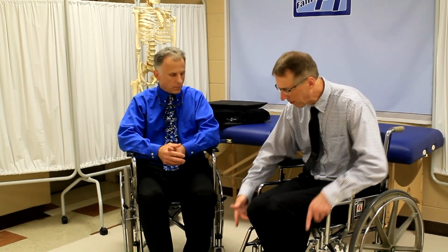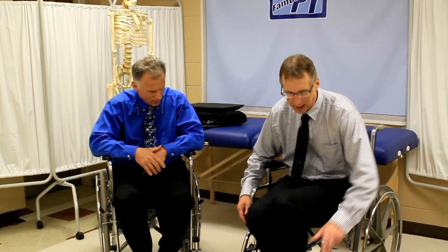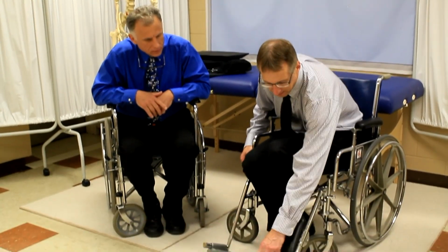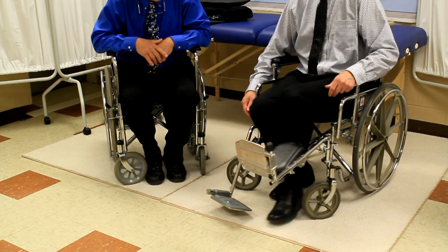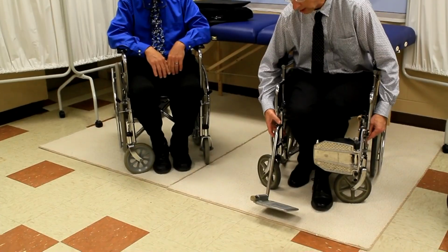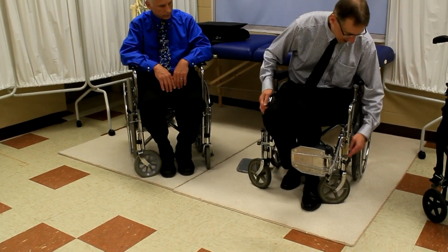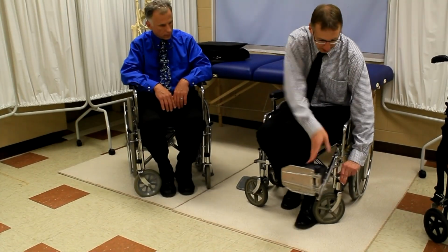Oh, didn't you talk about the footrest on this one? Oh my gosh, how come you said that, Bob? Yeah, this is an elevating footrest, okay? And this is just a regular foot plate. So they both are what we call swing away, where you can push and they just swing right out of the way. And this one swings right out of the way.